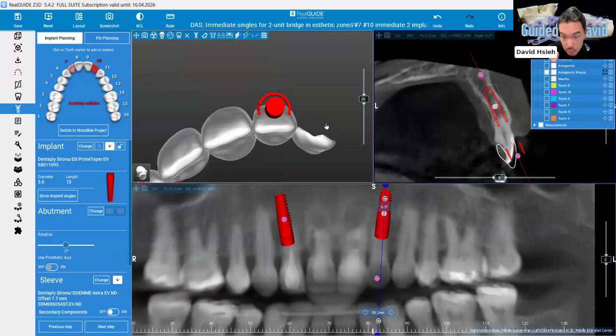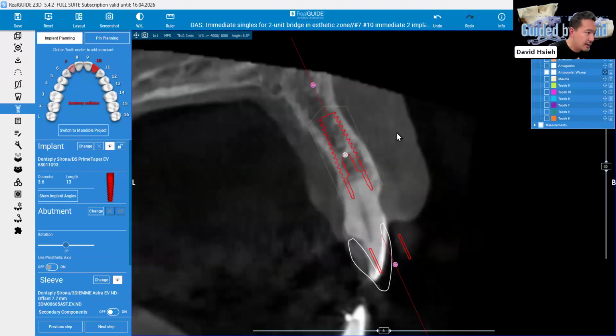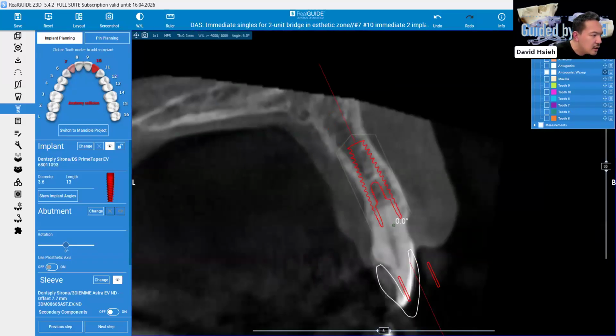So hard, right? But we know the bone height, so we can figure out the angle like that. So let's say 20 degrees, a little pushy, but it could save me right from there.